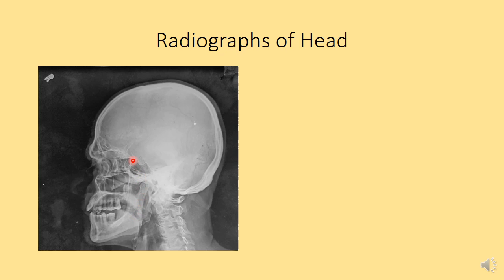And in the middle cranial fossa, you can appreciate sella turcica. This is the concave marking. You can see this is sella turcica, and just below that, this is body of the sphenoid and sphenoid air sinus. This black shadow is because of sphenoid air sinus.